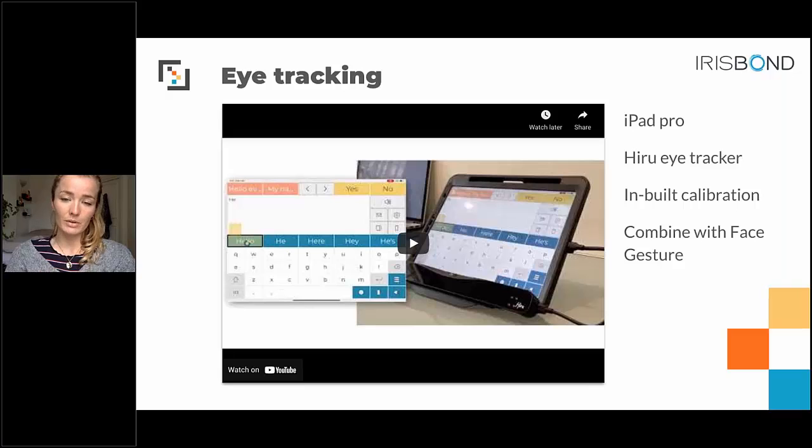If you go to the iPad settings in the accessibility section, there is a calibration screen allowing you to see how well you are positioned, depending on how you position your eye tracking camera, and allowing you to calibrate the device. You just have 5 points to follow on screen, so that the camera can track the pupils of your eyes more easily.